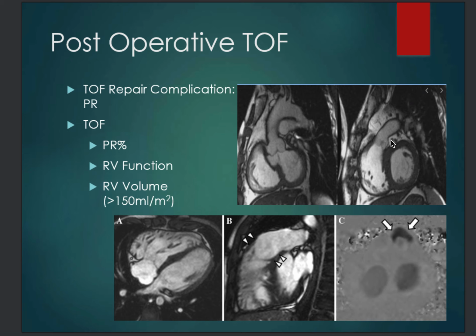If you see that this is very close, this is a red flag. The interventionist will test anyhow to see whether there is any compression to the LAD before putting the stent. But it's one of the flags that we could raise while reporting the Fallot cases post-operatively.